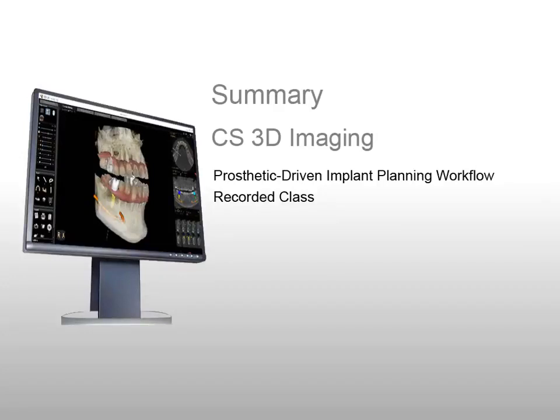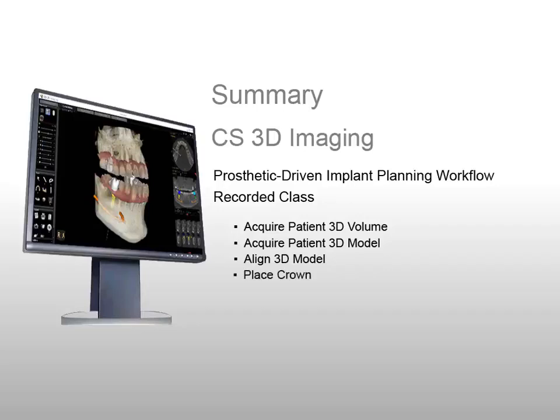Now you should be able to acquire a patient 3D volume, acquire a patient 3D model, align the model with the 3D volume, place a crown, place an implant, generate an implant planning report, and export the datasets for use with a third-party guided surgery system.